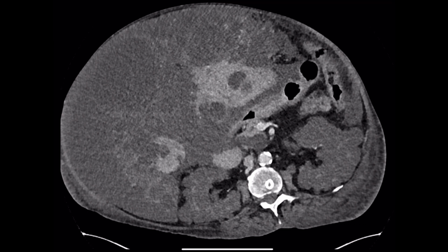You'll be able to ballot the kidneys in this case, and you'll be able to feel a large liver, and the CT scan is diagnostic. Absolutely. So it's diagnostic of polycystic kidney disease.